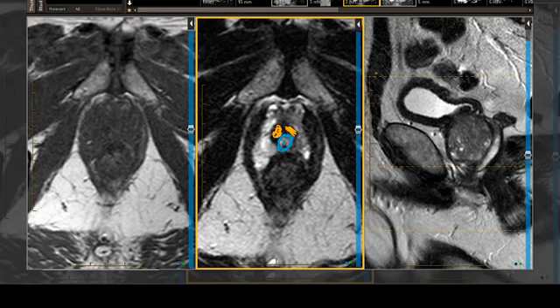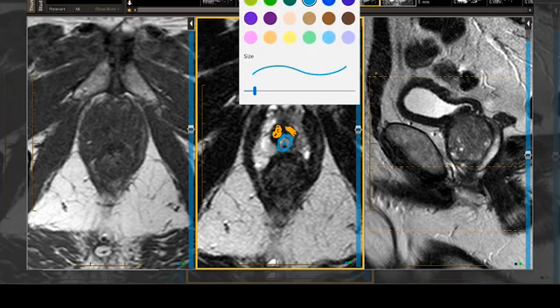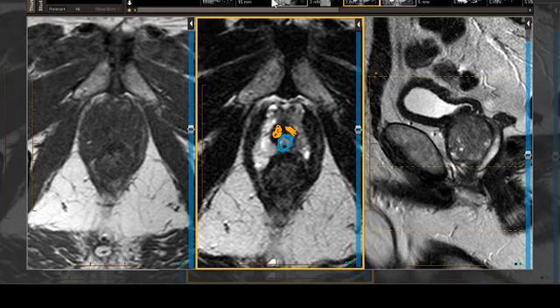Now let's color in the PZ. That's the brighter area, the peripheral zone. So let's make that red. So here's the right arcuate-shaped PZ, and I'm going to color it in for you. The right side is a little bit fatter down low than the left side, which is admittedly a little harder to see, but it's right there. And you're going to have a PZA, a PZP, and a PZM down low. So no central zone in the central gland down low.